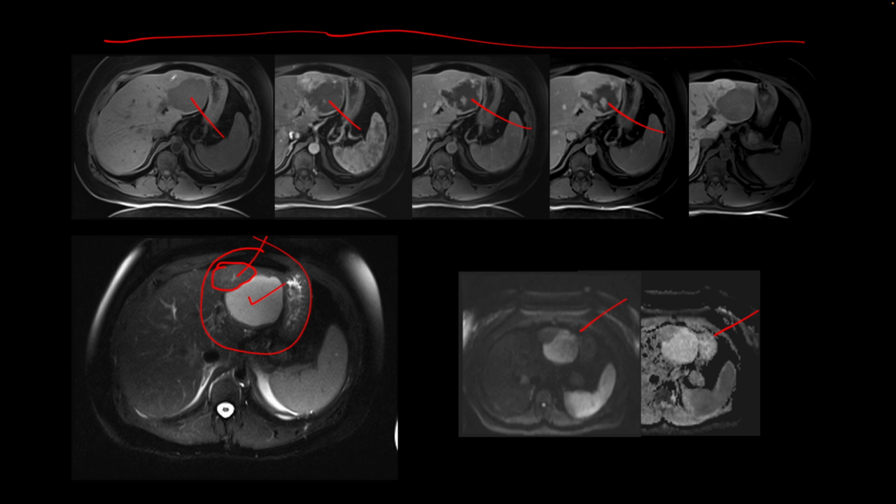And the other tumor shows arterial phase enhancement right there, and then on the much delayed phase, these are 20-minute delayed images, the contrast was Eovist. We find that there is contrast enhancement on the 20-minute delayed phase along with a hypoenhancing central scar. And so this other tumor is a FNH. And so sometimes two tumors or more than two tumors can exist side by side, and MRI is the best modality to evaluate and confirm these different tumors.